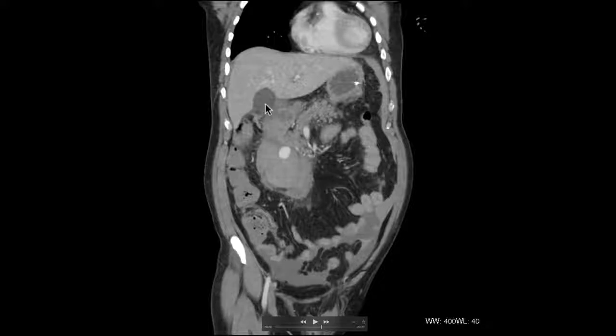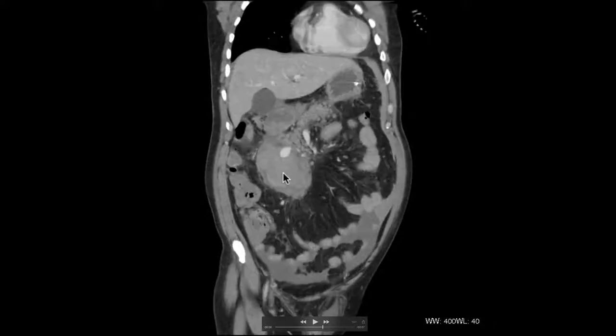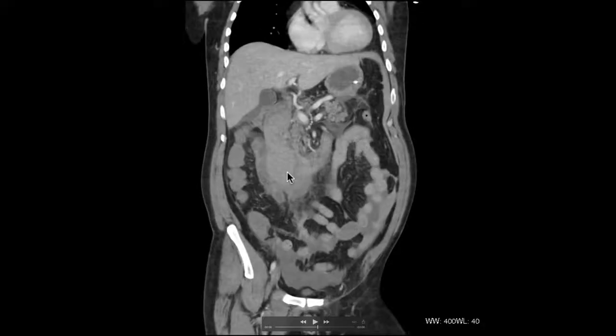So blood on a CT, again, it's a bit brighter than normal fluid, normally about 60 to 80 Hounsfield units for you to measure. Yeah, we can look it up on Wikipedia. There's a good page on Wikipedia at Hounsfield units.